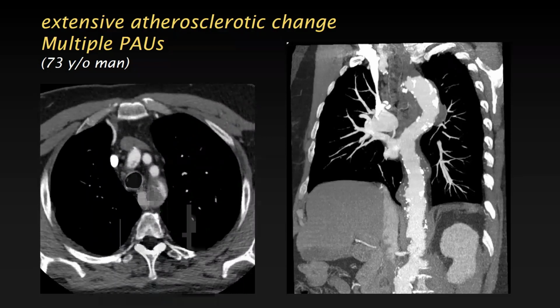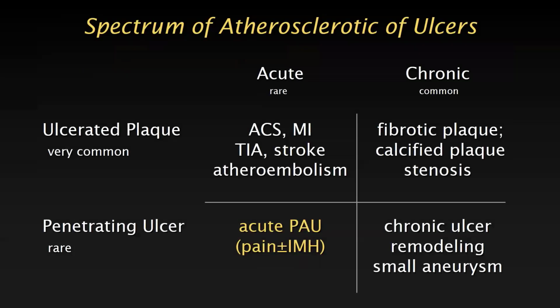So that's the patients who have penetrating atherosclerotic ulcers. And again, to have it in the big picture, to find out what we're really talking about, because the acute penetrating atherosclerotic ulcers, this is what we found all so dramatic, and this is what can be causing or presenting as an acute aortic syndrome.